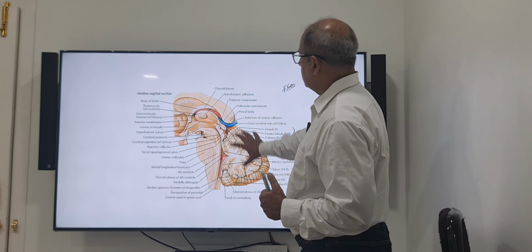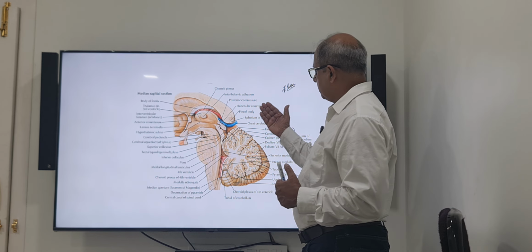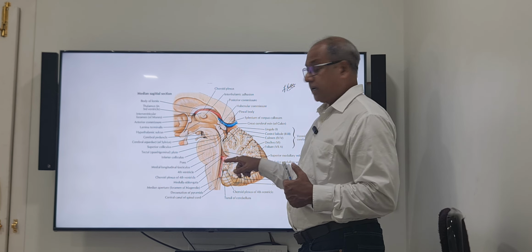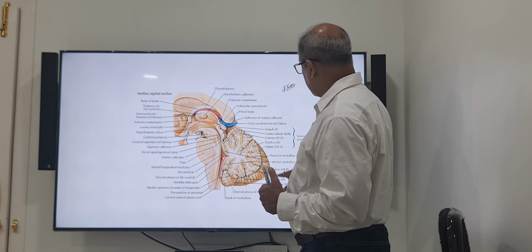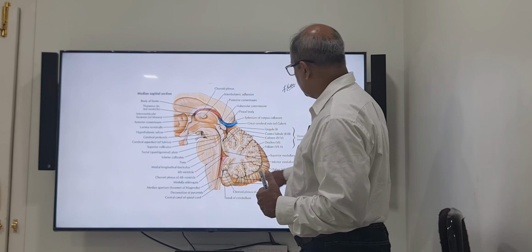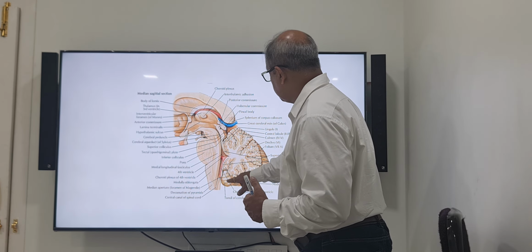And this is the posterior part of the fetal brain, where the arrangement of cerebellum, the cerebellum is cut sagittally. The sagittal part of the cerebellum, this median part is called vermis, and this vermis has different fissures and different areas. If you want to study, you can see these lobes also. These are the different lobes.